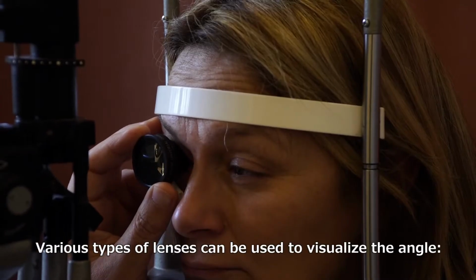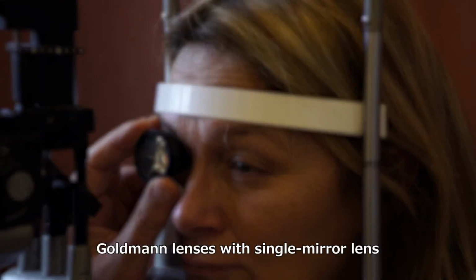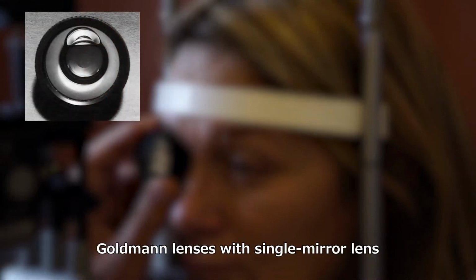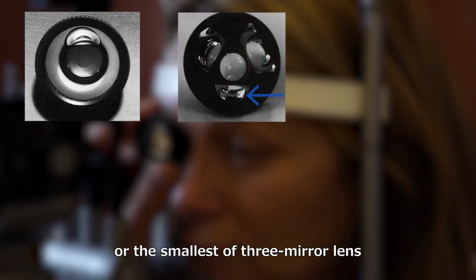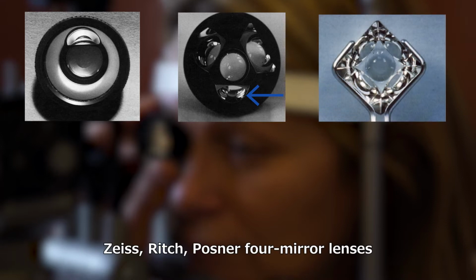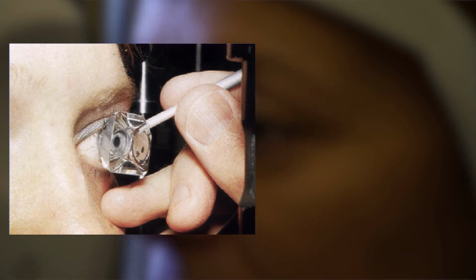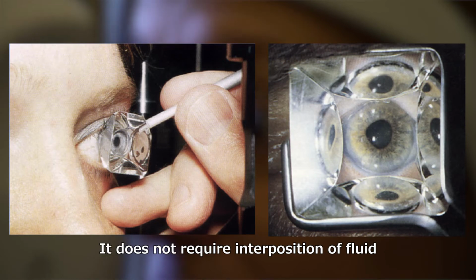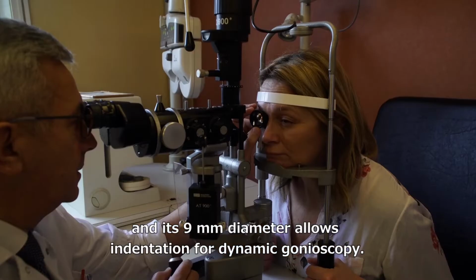Various types of lenses can be used to visualize the angle. Goldmann lenses, with the single mirror lens or the smallest of the three mirror lenses, and Zeiss Posner four-mirror lenses. The Posner four-mirror lens provides maximum visibility with minimum rotation. It does not require interposition of fluid, and its 9 mm diameter allows indentation for dynamic gonioscopy.